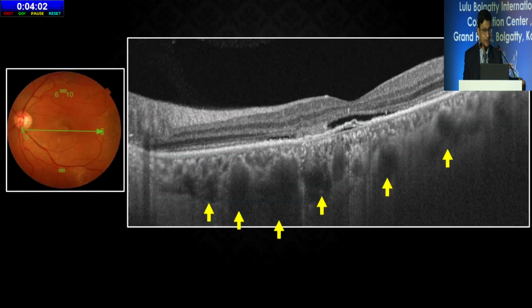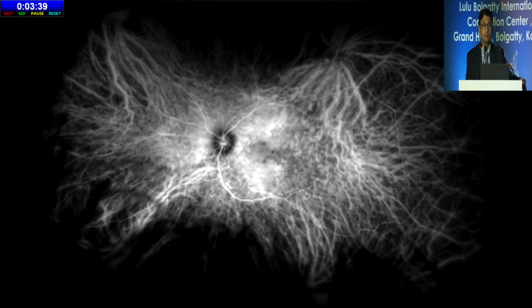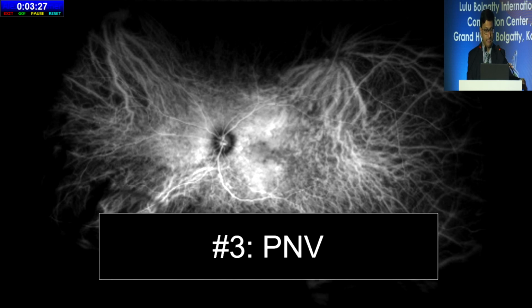Again, going back to the fundus photograph, this patient does not have any drusen or any other feature of AMD. And this is when you should look at the other differentials. When you have a pachychoroid, in general, eyes with AMD will have a thinner choroid. But if you have a pachychoroid spectrum, look at other possibilities and look at PNV, which I think is often under recognized in our clinics. The importance of doing that is that these patients can have an overlap. So patients with PNV can progress to develop PCV. They can have a concomitant CSC. It's a whole story once you diagnose pachychoroid.